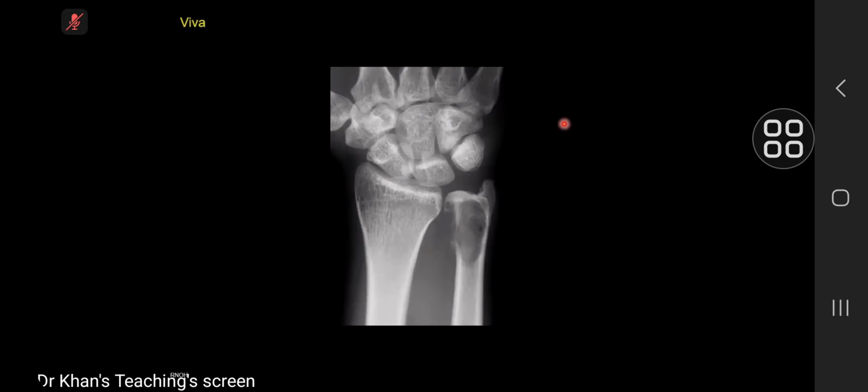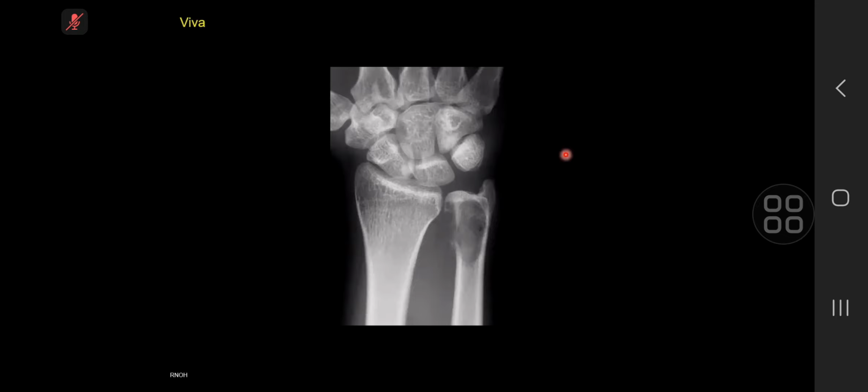Yeah. For an adult patient, there is an abnormality in the distal ulna where there is a lucent lesion with a narrow zone of transition. I can't see any sclerotic margin around the lesion. There's evidence of cortical destruction at the radial side of the lesion with some periosteal reaction also. There's possibly some soft tissue involvement beyond that cortex.